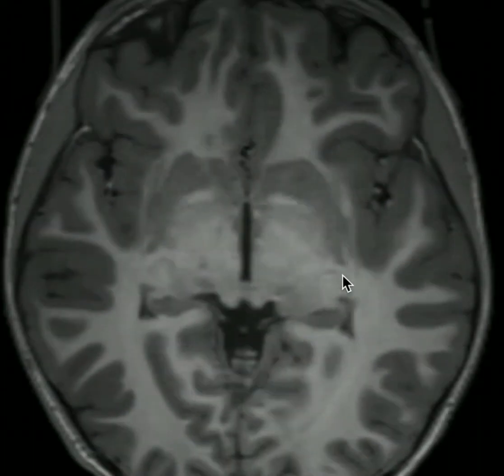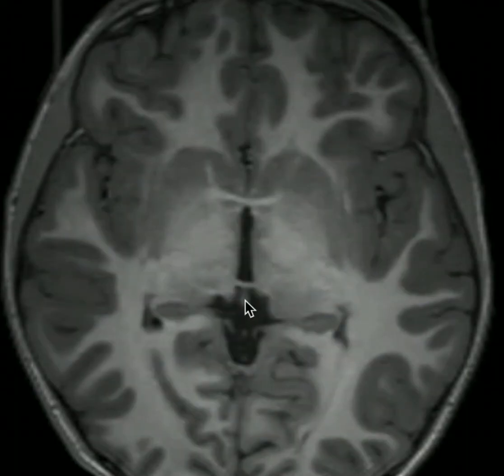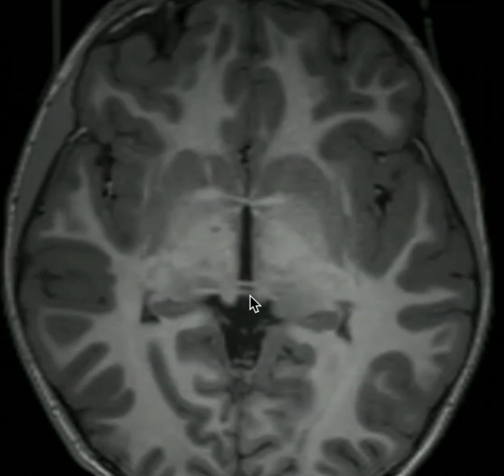Scrolling back up now to our level of our third ventricle right here, I'll point out that posteriorly we're seeing the right and left habenula, which will come together at the habenular commissure right above our pineal gland, which we're seeing here. We'll see our pineal gland better if I scroll down one slice. Right here, this is our pineal gland. Scrolling more inferiorly now, we'll see our posterior commissure right here. This is our third ventricle, which is slit-like between the right and left thalamus.